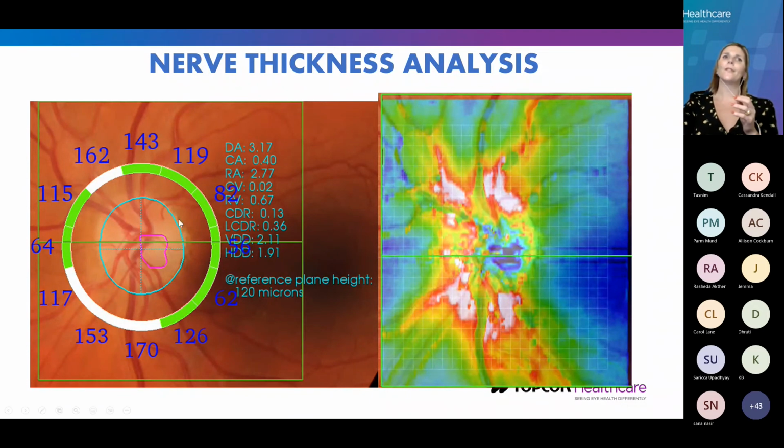Again, you will get thickening and thinning ideas from looking at the circle sector wheels. And again, you get temperature thickness maps in relation to retinal nerve fibre layer. I always think of the retinal nerve fibre layer as a butterfly. You know, we know the superior and the inferior bundles are thickest, and we know that we kind of have these wings that splay out. And actually being able to visualize the retinal nerve fibre layer en face, which means we're looking at a structure from above, is really quite nice for us to understand how that retinal nerve fibre layer and ganglion cell sectors all lead around into that very fine and delicate area that we call our vulnerability zone.